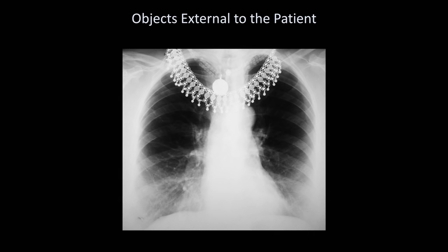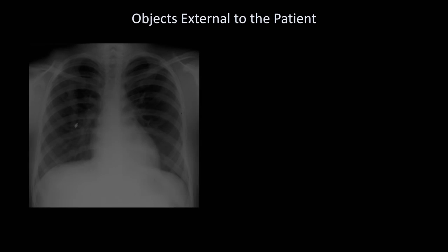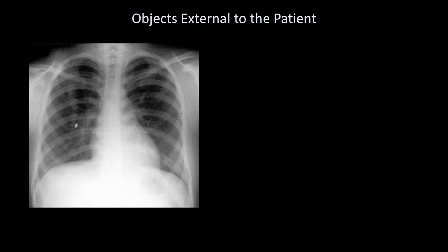The very last thing I'd like to cover in this video is not part of airways, bones, and soft tissues, but this seemed like the most obvious place to mention it. That is, when interpreting x-rays, be sure to identify objects that are external to the patient. Sometimes, these will be obvious, but not always. Consider this x-ray. What do you see? There's obviously a very dense, small thing seen right in the middle of the right lung, but if you look closer, you'll also notice a superimposed, large, vertically oriented linear opacity. For those not sure what I'm talking about, let me outline it.